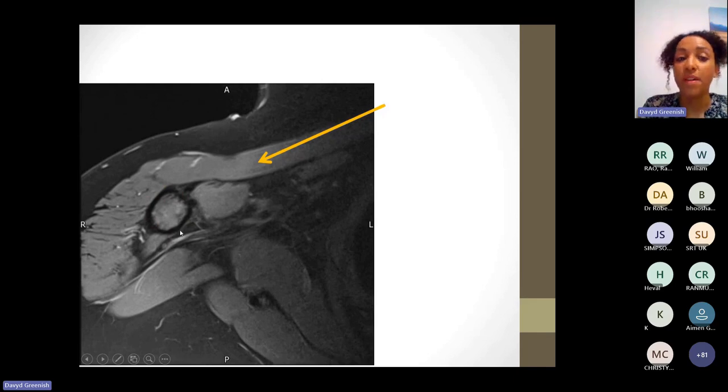So this is bone, and we're in a part of the body where there's a single bone, okay? But then just here we catch a bit of the scapula, and that's classic appearance for the scapula in that orientation. And then we've got black here in this part of the image, so that looks like lung. So we know that scapula is a posterior structure, the lung is going to be medial, and we've got humerus, so it's all fitting. Going back to our question, this grey here, what type of structure are we looking for? It's a muscle. Anyone know what muscle this is?